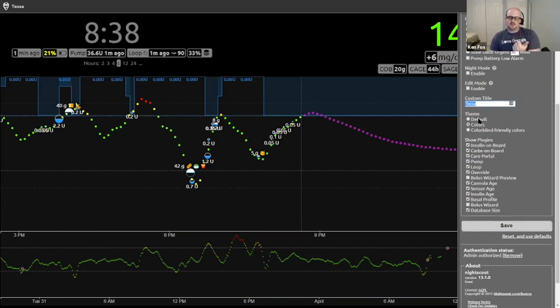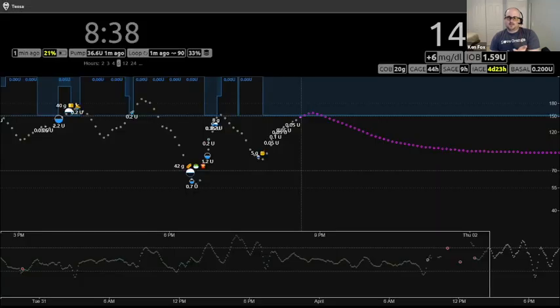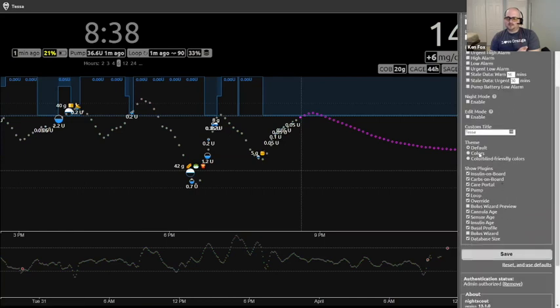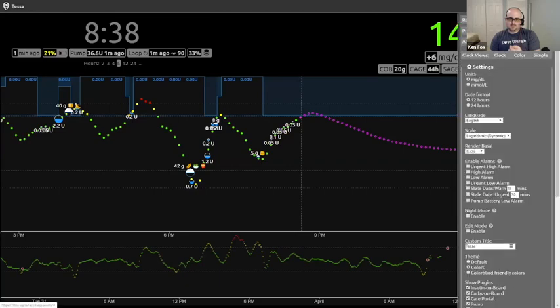Theme, some people get it stuck on default and that's kind of ugly. It's kind of gray and boring like this, which I guess is okay, but I prefer the colors. So, you know, two colors.